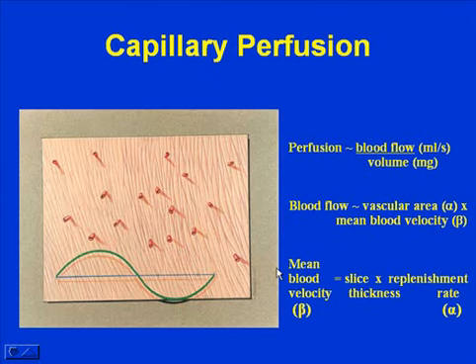Now, it became clear that with color Doppler, we were in fact not seeing the capillaries that are integral in the tumor angiogenesis process. In order for us to get a Doppler signal, a lot of these small capillaries would have to be flowing at the same time, 100 or more, to give a Doppler signal.